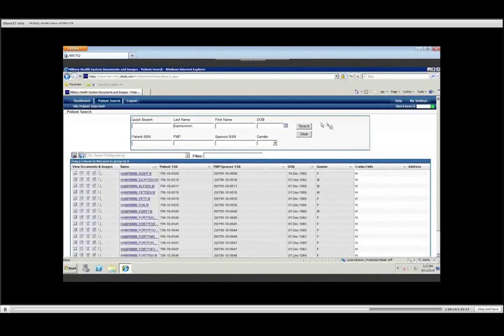When you're doing a search in standalone HAIMS, it's important to realize you do not have that little function that AHLTA provides that allows you to search your local area. When you search in standalone HAIMS, it will search the entire world, all of the assets, all of the records. So if you have a generic name such as Smith, first name John, you are definitely going to want to fill in more identifying information to help narrow your search.